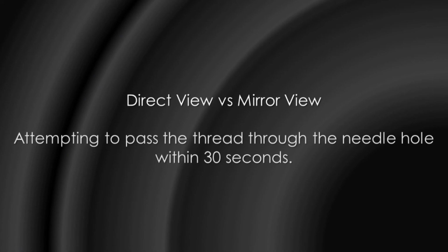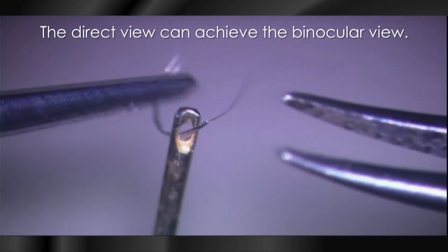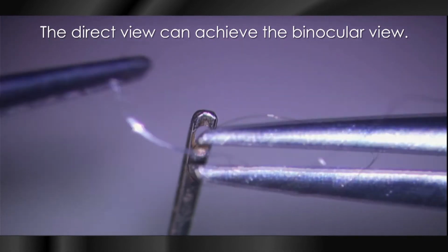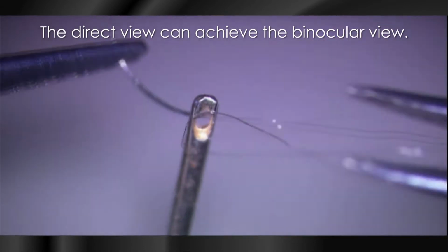Direct view versus mirror view, attempting to pass the thread through the needle hole within 30 seconds. This is a direct view. So, the direct view can achieve the binocular view.